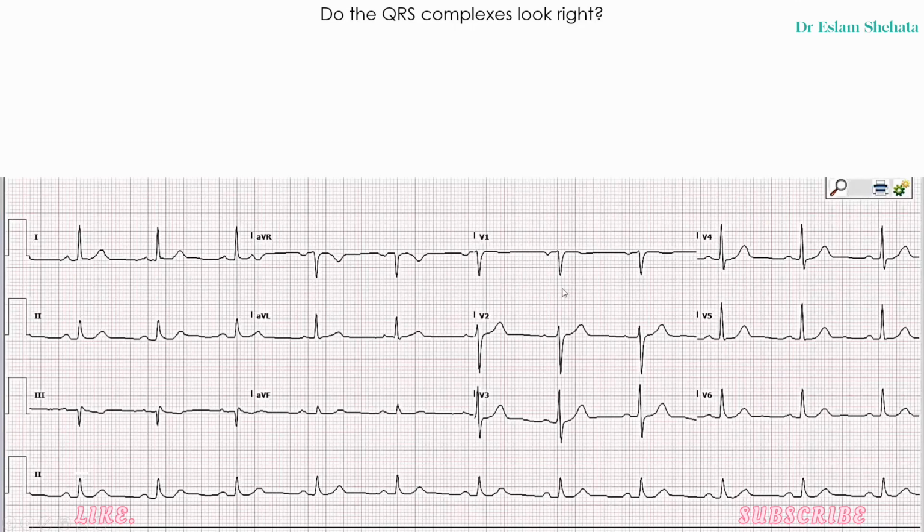And then we said we'd talk about Q waves. So, no Q waves here. Again, little R wave making this an S wave. So, no Q waves. No Q waves to be seen. So, not really much going on from a Q wave perspective. Maybe a small Q wave there. But again, it's small, so there are no abnormal Q waves in this ECG.